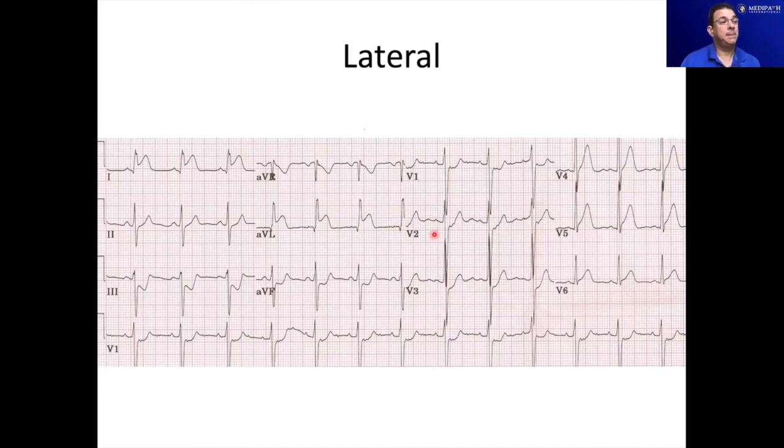And can you discuss the EKG finding of J point elevation versus true ST elevation? Yeah. So the difference with J point elevation versus ST elevation is that looking for reciprocal changes for me is the best way to find it. J point elevation should be consistent across the limb leads, V1, V2, usually aVF, aVL, and the anterior V leads.